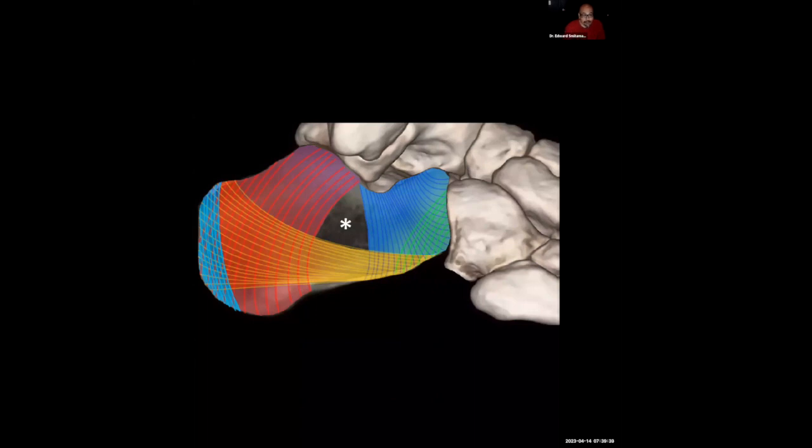That's an important landmark for our surgeons, because it's such a dense area right around here. It's oftentimes also used as a fixation point for a screw. But what I want to highlight here is this asterisk. There's a relative paucity of trabeculae here, beneath this critical angle of Gissane.